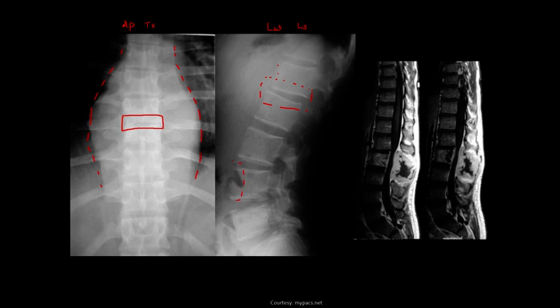This in here is probably gas, though I would still expect to see normal cortex, so there might be more subligamentous spread. We can see this region, the cortex is not so well visualized. So we've got infectious change here, infectious change here, and questionable change here.